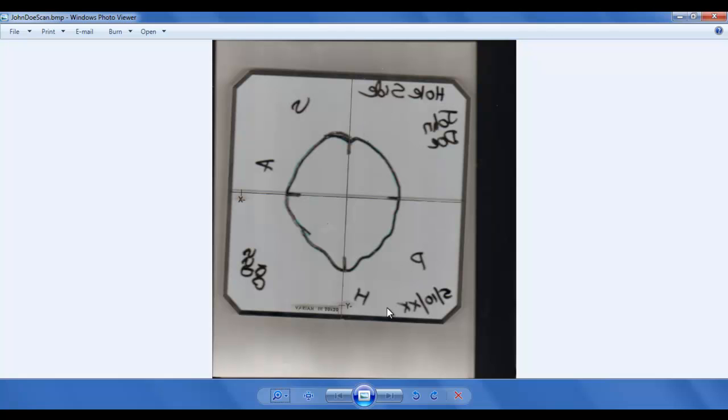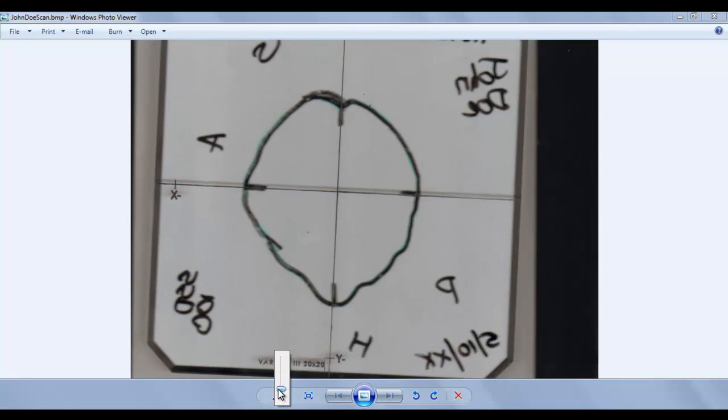Feel free to have notes, have whatever you need on this block that's important for your clinic or your facility, but make sure that within the contour region you try to keep that area clean and crisp, because you'll see that within the digitizer wizard it's going to make it much easier if there's not any writing inside of the block cutout field for us. Make sure your line is as dark as you can, and make sure that if you are digitizing and you're not the one who's also drawing the images, you understand which side of the image you need to be digitizing to. And we'll kind of see that as we go through today, but this line can be pretty thick, so make sure you know or you communicate with whoever drew these images.